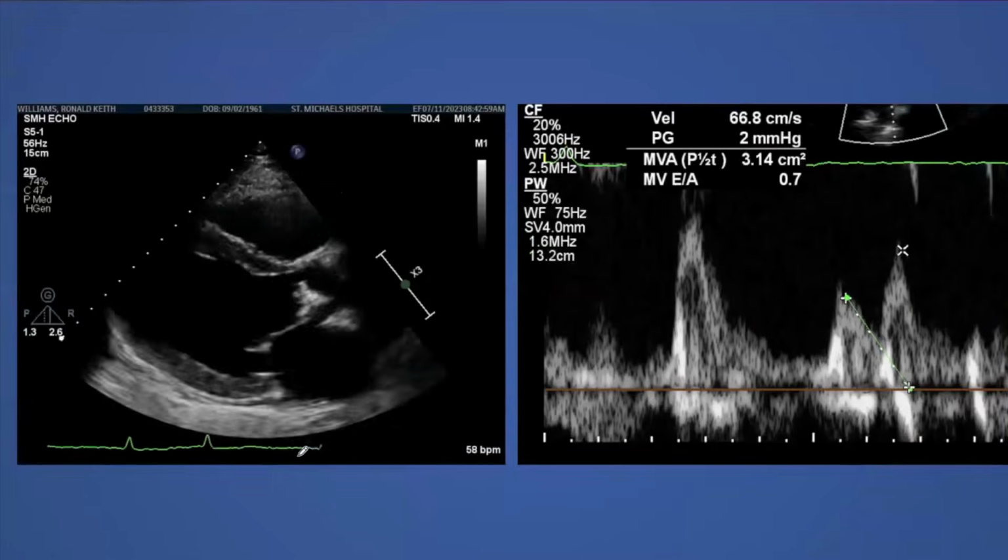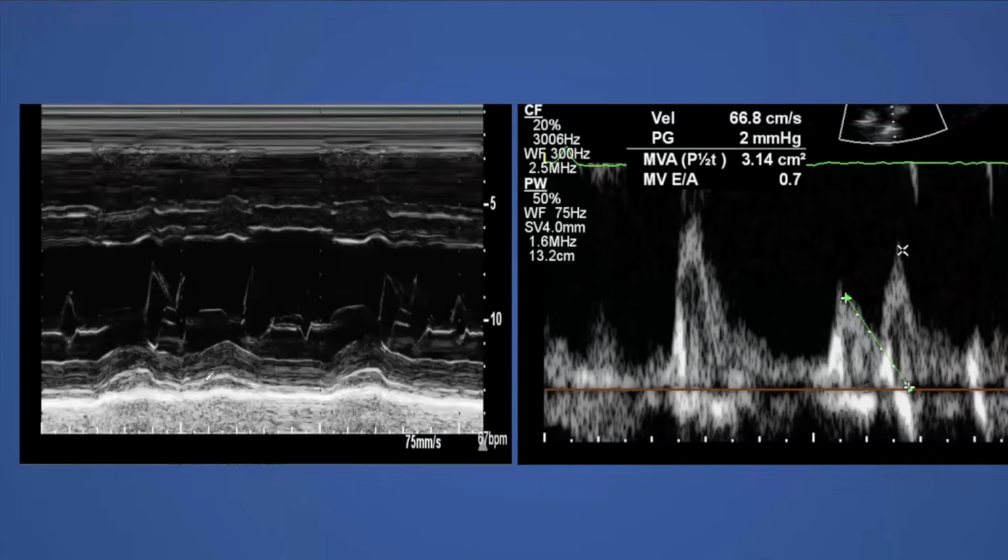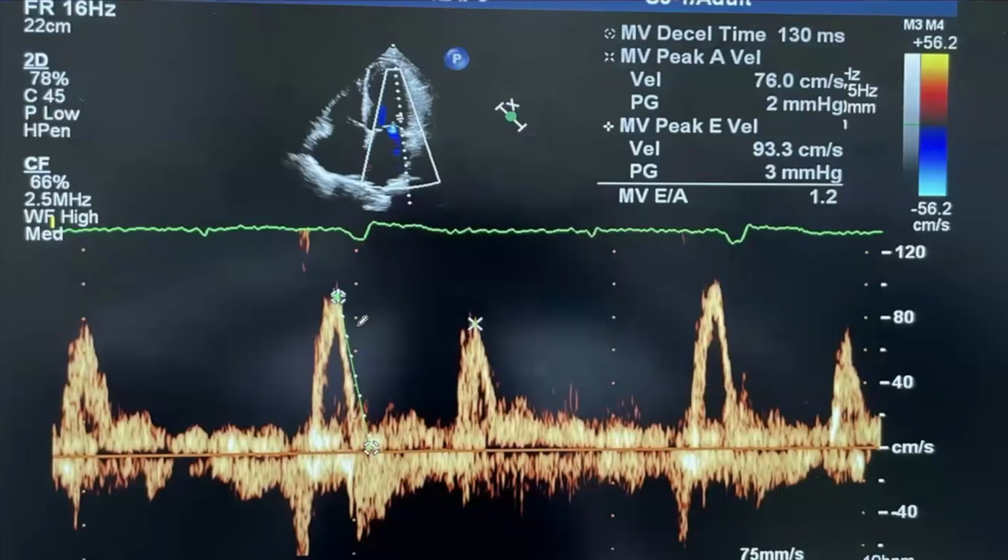So always look at the inflow. How does it look when the mitral doesn't open very well, like that, this motion? You will know that you don't have the regular sinus rhythm, or whatever abnormality. And then you can correlate here. This is really just to show you how the M-mode can tell you about the inflow. The same idea. This is a beat, this is a different beat, and it was taken as EA.